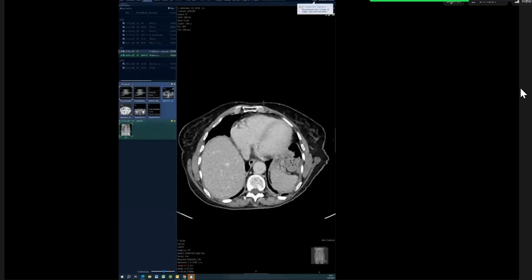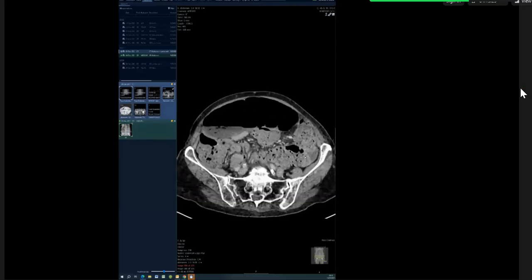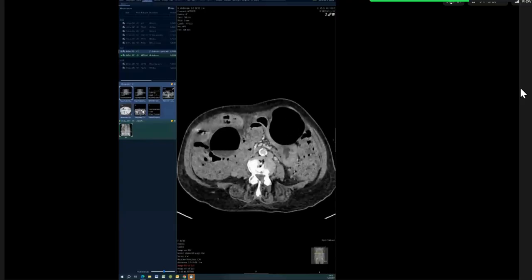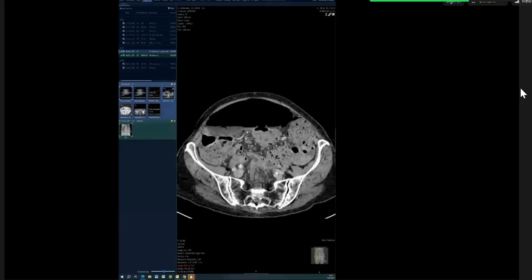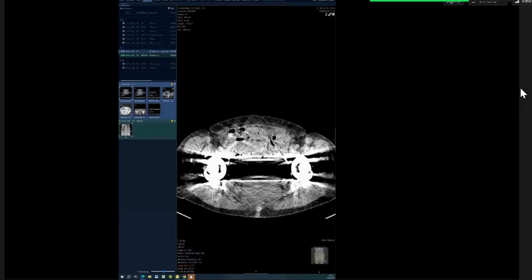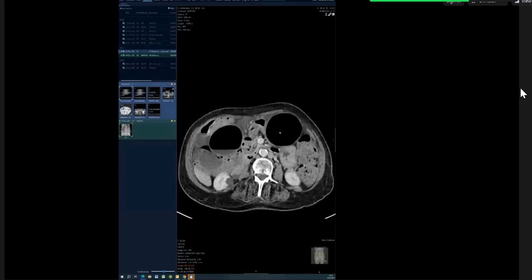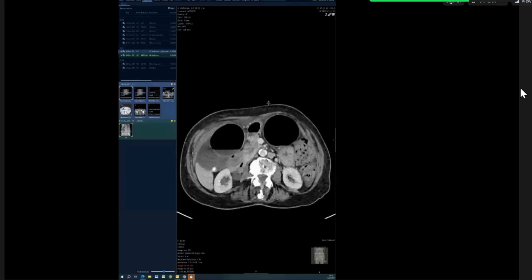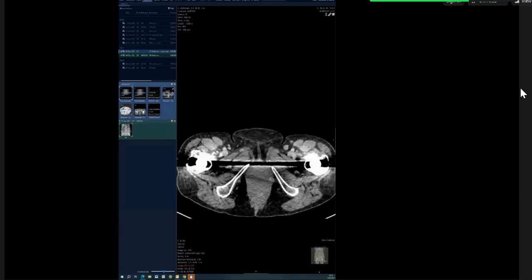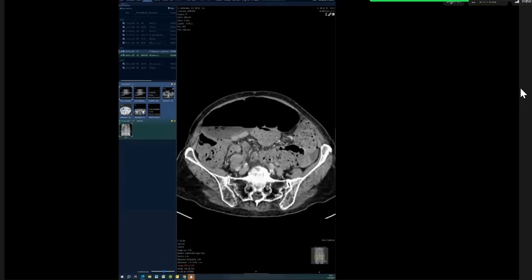Okay, so I would ask again that you follow the rectum up. This is the descending going up, ascending going down, so the transverse. So all this feces-filled bowel is the large bowel, and then there's this dilated loop that goes all the way up, turns on itself, goes all the way down. Does that confirm your sigmoid volvulus? I just want to see the coronal to confirm. Okay.